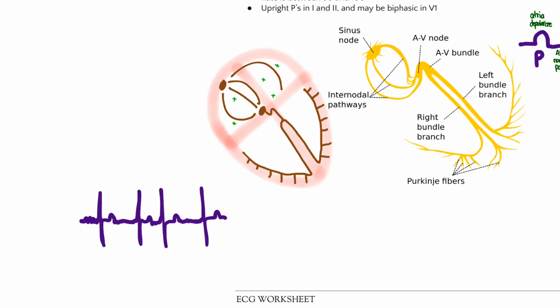So what are we seeing here? It's a couple of things. Number one, there are no P waves, right? Because it wasn't following this standard conduction through the SA node and through these pathways. We're also seeing that these are kind of not happening at regular intervals, right? Some are further apart and some of them are closer. And we knew that was going to happen too, right? Because some of these were further apart. This is going to take longer to reach there because we know that it's not taking the superconducting highways.